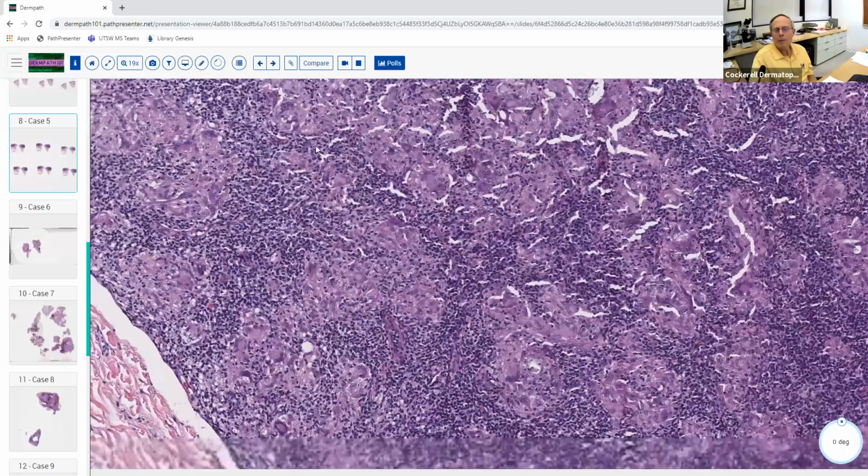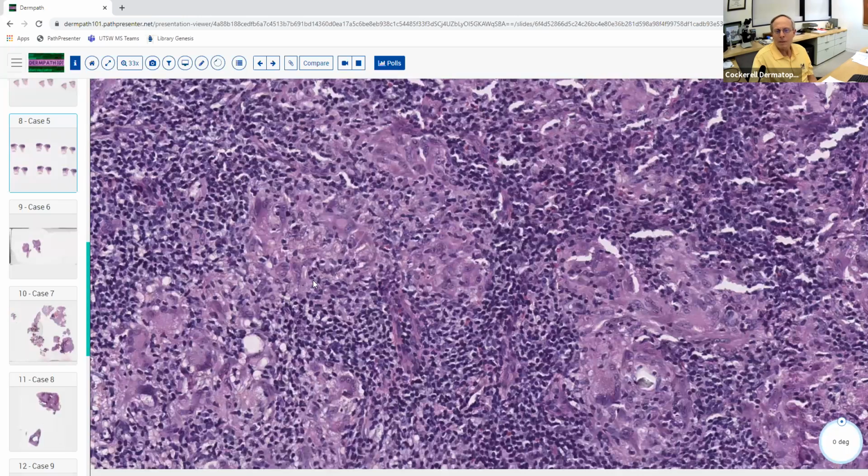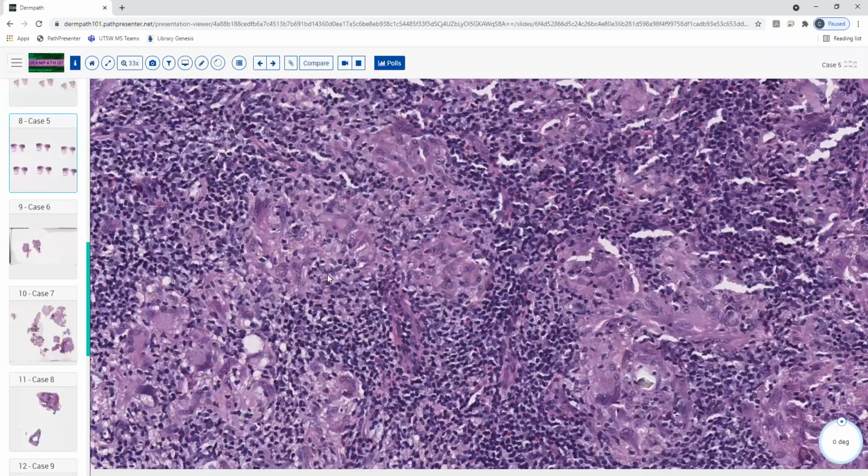I'm sort of forming the pattern. I would say you've got inflammatory cells surrounding these granulomatous areas. Are you referring to perhaps caseating versus non-caseating? Well, yeah, you can see it's definitely not.